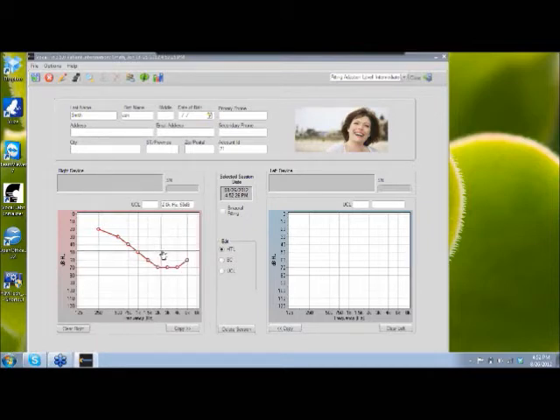Once you put these in, you can go up above and click again if you want to move them. If you want to remove them altogether, if you right-click with your mouse, by using the right-click button, it will actually remove the ones that you put down. So left-click lays them, right-click removes them.